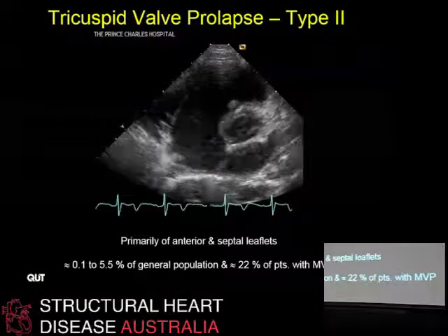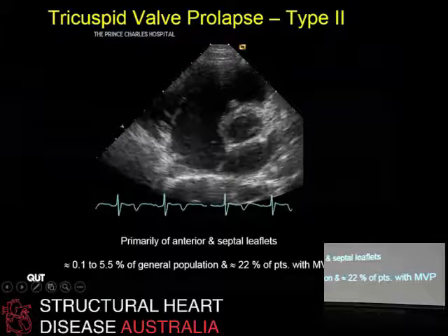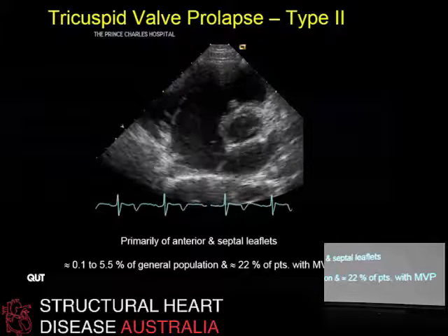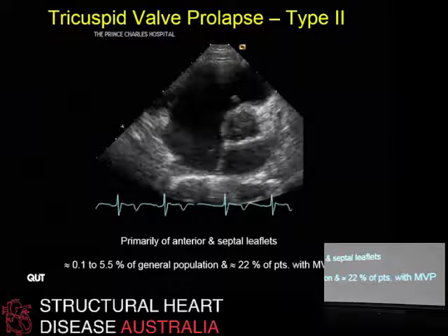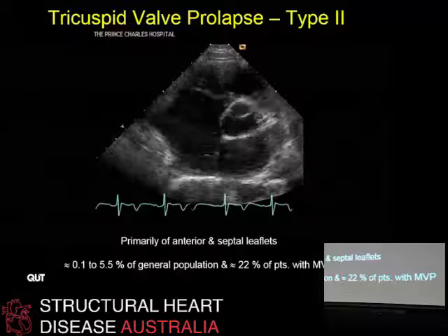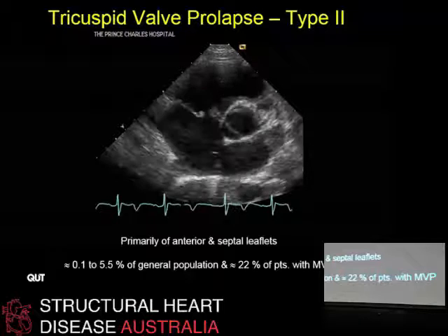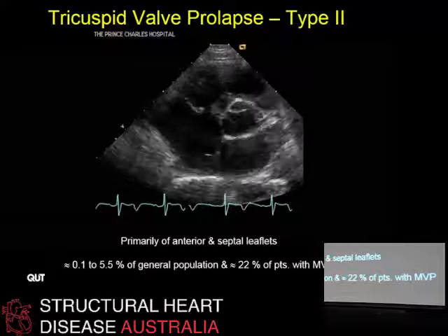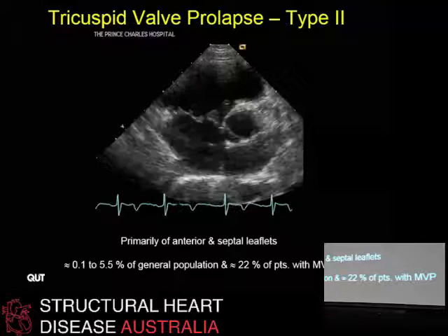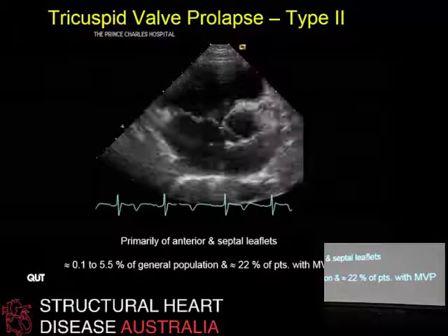In this short axis view, we see a case of tricuspid valve prolapse, or type 2 dysfunction. Primary tricuspid valve prolapse is very rare, and when it does occur, it's usually in the context of mitral valve prolapse. The anterior and septal leaflets are most commonly affected, and in this particular example you can see prolapse of the anterior leaflet and some redundancy of the septal leaflet.